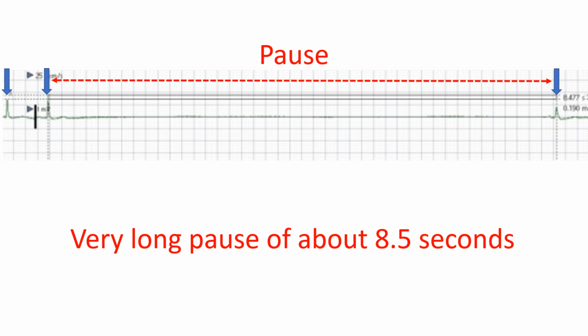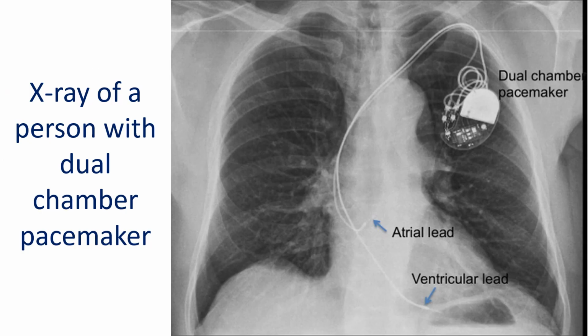It could be intermittent or prolonged sinus arrest. Intermittent sinus arrest will appear like skipping of a P wave, while prolonged sinus arrest will appear as a prolonged pause. Sometimes a slower pacemaker at the atrioventricular junction or the ventricles may take over signal generation. Sinus arrest is one of the manifestations of a disease known as sick sinus syndrome.